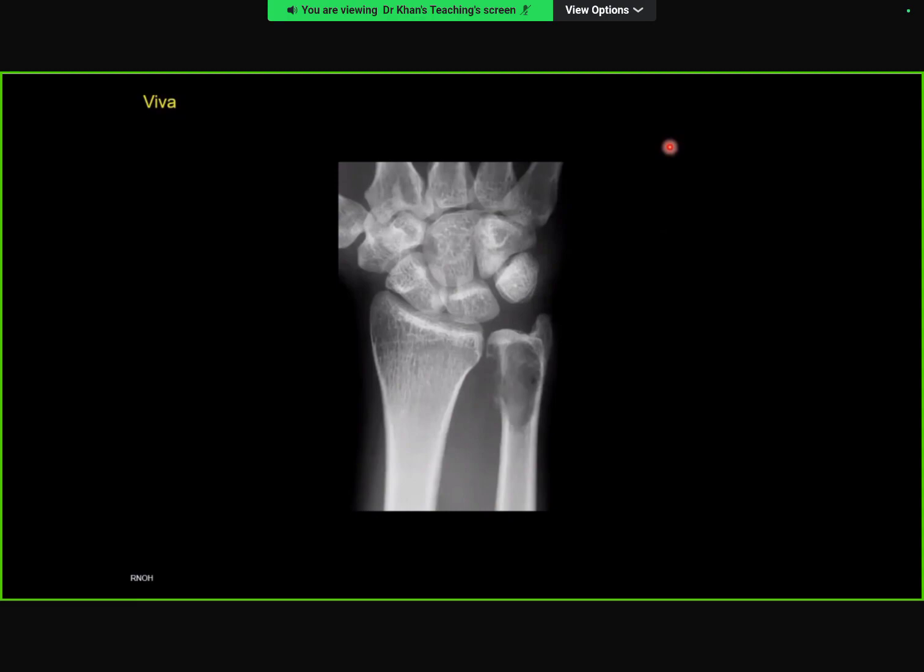Depending on the age of the patient, if they were younger, sort of in their 20s or 30s, I'd also possibly consider... Actually, no. I think that's my only differential. What is your final conclusion, please?